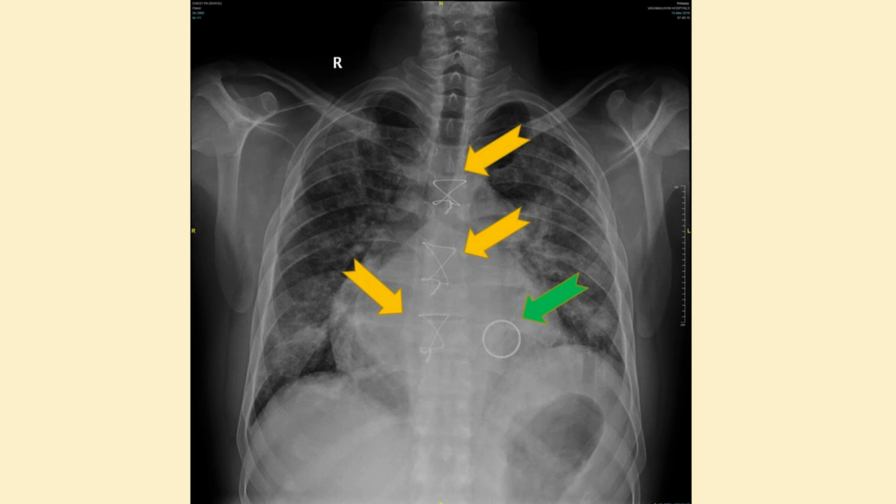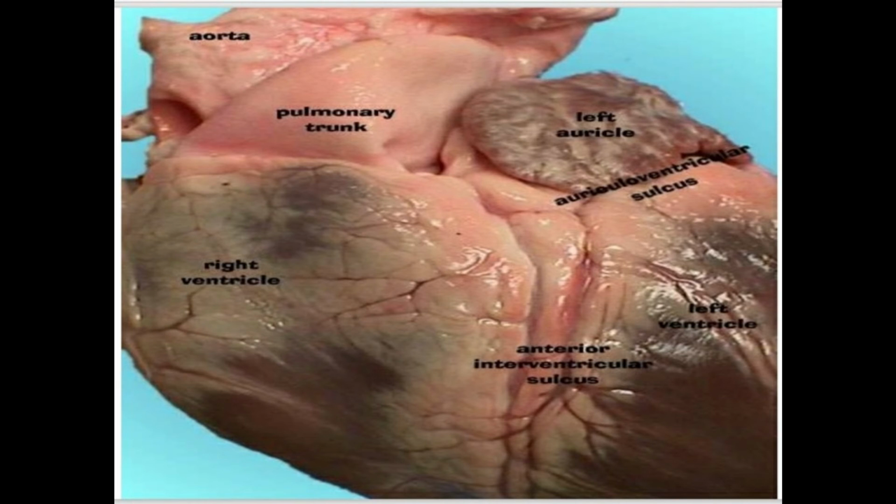The last question in our quiz was, what treatment had the patient undergone? I think nobody would miss the findings because it's highly catching, with the presence of sternotomy sutures and the mitral prosthetic valve in the X-ray chest. Now we will discuss the X-ray chest findings in mitral stenosis.